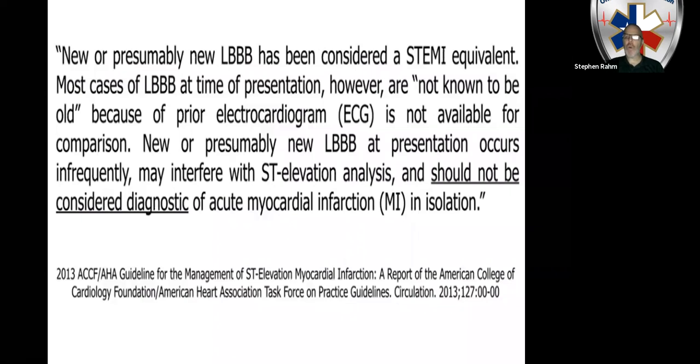And if you guys will recall, prior to 2013, in our regional heart alert criteria, we had the signs and symptoms of ACS plus ST elevation of 1 millimeter or greater in 2 or more contiguous leads, or new or presumably new left bundle branch block. That has since been removed. So left bundle branch block in and of itself is not a STEMI equivalent.